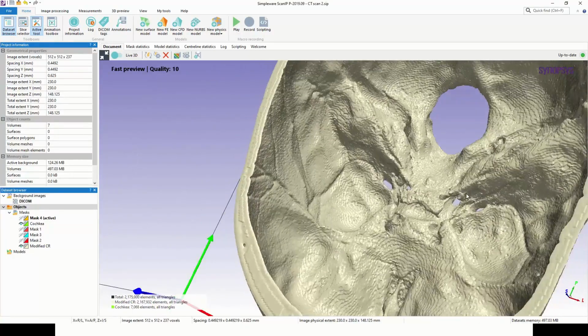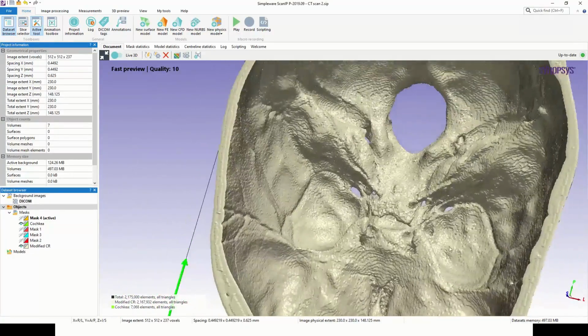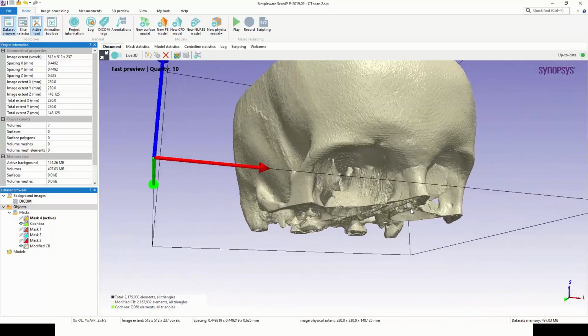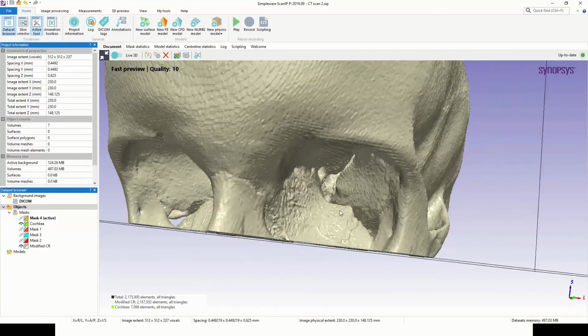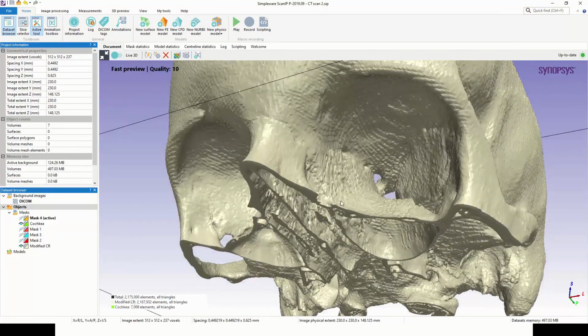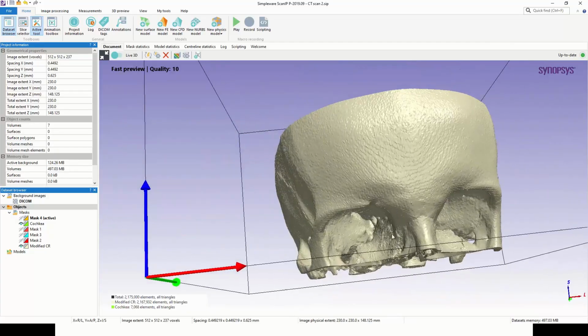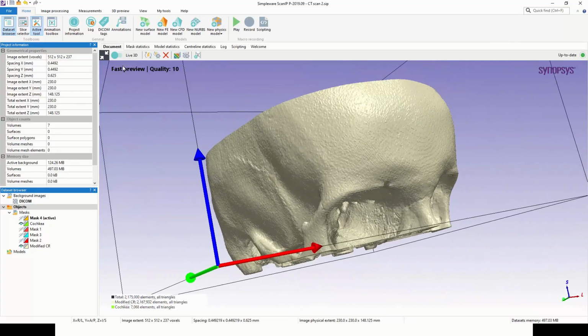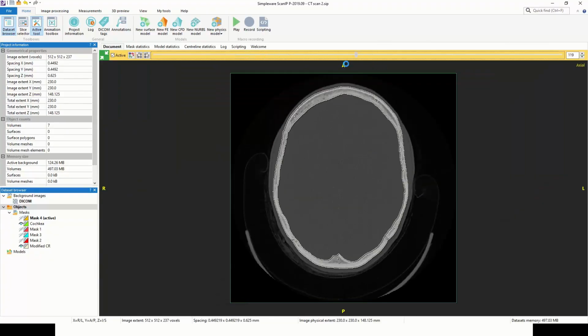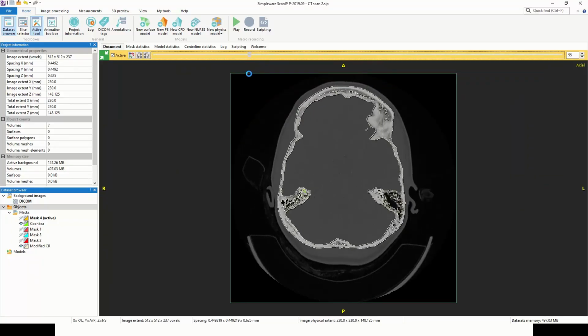of the foramen and the fossa where the vasculature and the nerves will travel through, of specific importance as well, and where a lot of time was spent in the 3D modeling reconstruction was around the nasal bones, the septums, the very, very thin bones here in the base of skull. And just so we can appreciate that, I'll give us a quick axial fly through of this particular model.